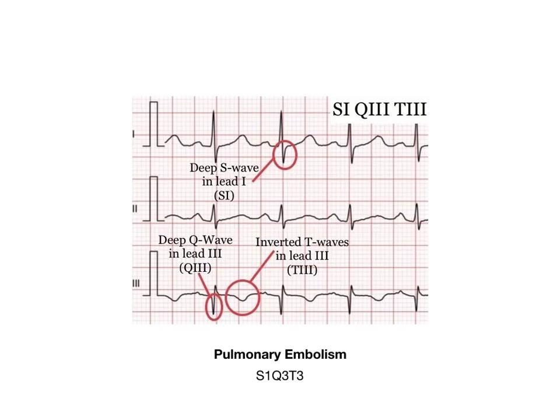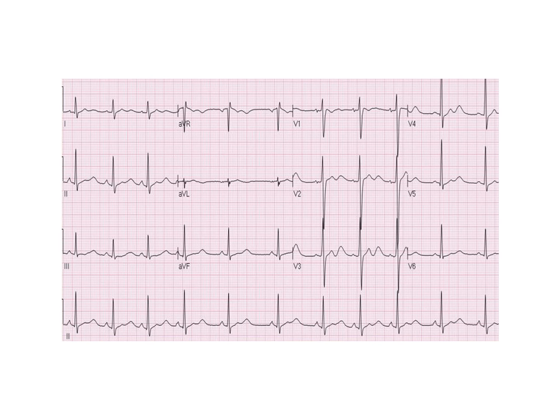You should look for the pathognomonic finding associated as a buzzword with your answer. So that is a pulmonary embolism, S1, Q3, T3. Let's move on to our next example. What do you see here? Now, I'll give you a little hint. I'm not looking for an answer to like a disease here. I'm looking for sort of a symptom. Pause the video if you need more time, but in a few seconds, I'm going to give you the answer.